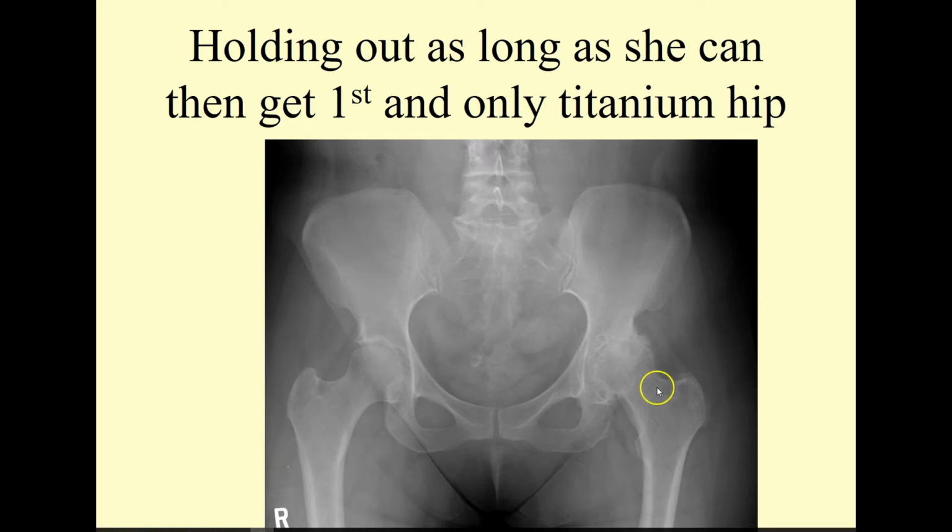So take a look at this. This really is demonstrating everything. Take a look at the good side here. Again, you can see joint spacing between the acetabulum and the femur head. Femur head contour is nice and smooth and round. Teardrop distance, axial distance, all really pretty good.